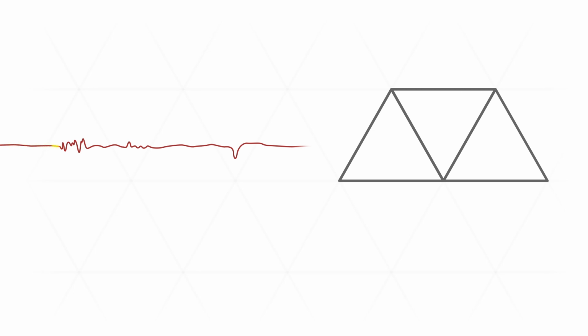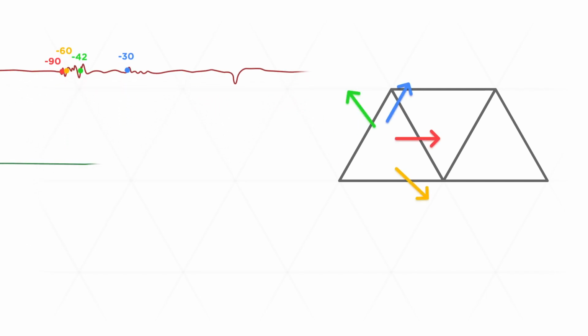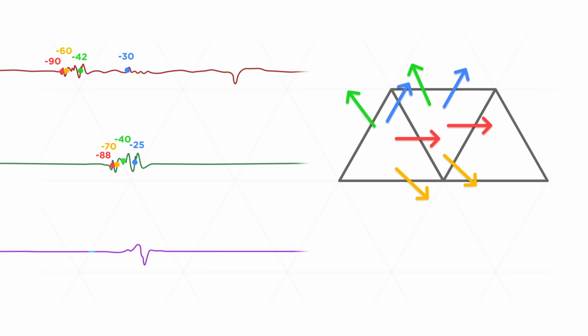In the case of complex fractionated signals, Coherent utilizes wavefront to identify all possible sites of annotation and then considers the global pattern of activation to determine which annotation is correct. Any outlier vectors are identified and removed.